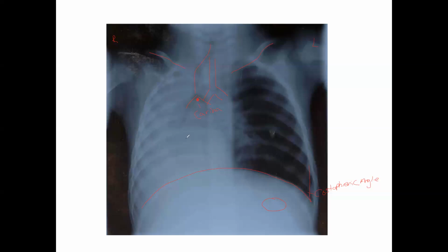In this particular instance, what's happened is we're seeing a mediastinal shift and a tracheal shift toward the patient's right side. So you've got an increase in atelectasis and consolidation, potentially a pneumonia, on the right side for this particular patient. And that has created the pulling effect. So that has pulled the trachea toward the affected side.